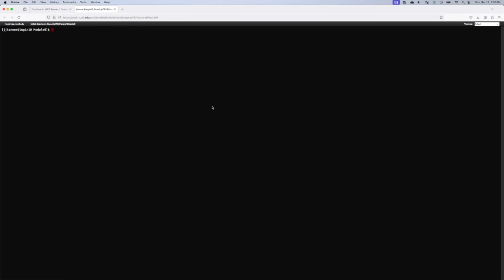And so I am now in this module 9 folder. Type ls. There's only one zip file. If there's anything else in there, somebody else has created an extra file in there that should not be in there. And if the person did create it, then delete it. Don't delete this zip file though.